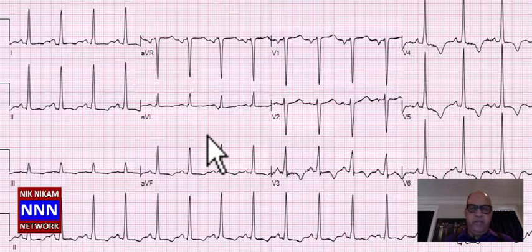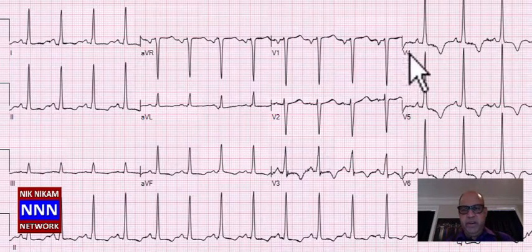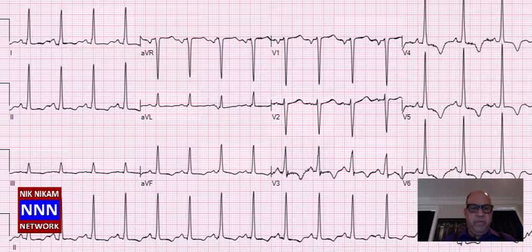So this is a very interesting electrocardiogram, a classic finding of left ventricular hypertrophy with left atrial enlargement, increased left ventricular voltage, along with the secondary repolarization changes due to left ventricular hypertrophy. And if you were to do an echocardiogram in this patient, you are going to see left ventricular hypertrophy, possibly diastolic dysfunction, left atrial enlargement, and all these findings will be confirmed by echocardiography.